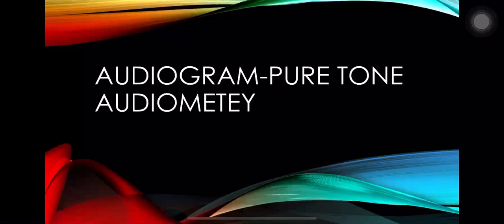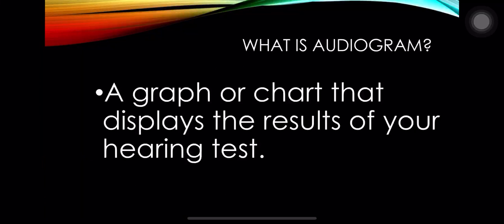Hello everyone. Today we are going to see about audiogram or pure tone audiometry. First of all, what is an audiogram? It's a graph or chart that displays the results of your hearing test.